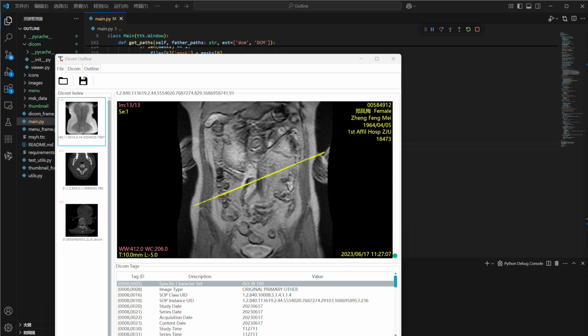Now we can see the GUI and its function. The GUI is mainly made of 4 parts. At the top, there is a menu bar. I do recommend using keyboard shortcuts to work more efficiently, but we also added buttons to help with the process. And I tried to give each button a small animation. And I really like that part.